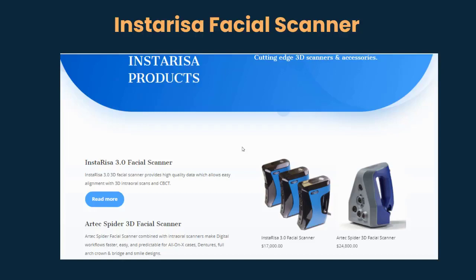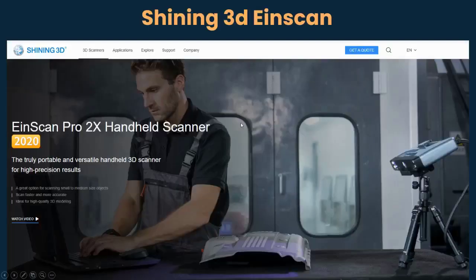It's got a nice software that is a little bit more geared towards dentistry, so it actually will prompt you, okay, do a facial scan smiling, do a facial scan at repose, do a facial scan with retractors in so that you can see the teeth really well for stitching in the STLs of the teeth. So I like this one a lot. A little pricier than the others, or well, than this one at least.